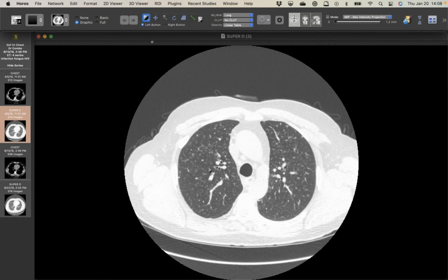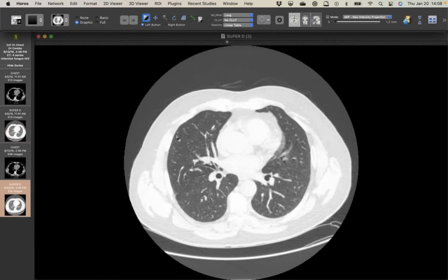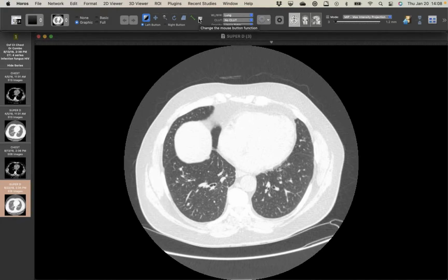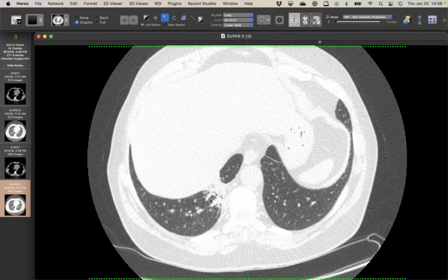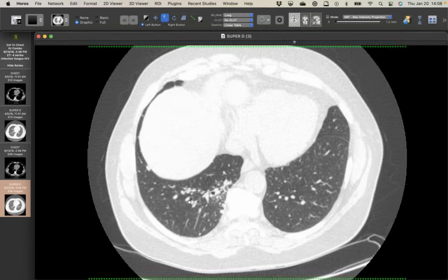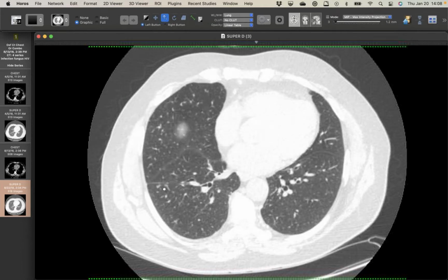What I thought was interesting, so he got treated with itraconazole standard therapy. So this is him 16 months later. And an important point, I know, Howard, you have a lot more experience with Cocci than I do, but I've seen enough of it here with our snowbirds and just traveling patients. The cavity you can see collapsed down quite a bit. There's a little calcification in it. There's a little bit of bronchiectasis, but you'll notice these nodules persisted, although there are fewer of them and some of the cavitary ones collapsed down a little bit.